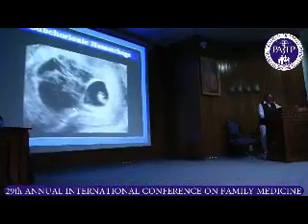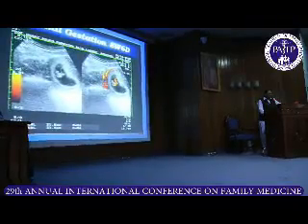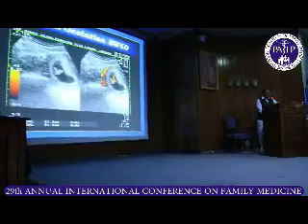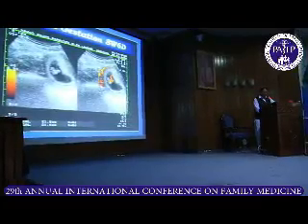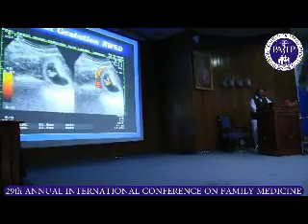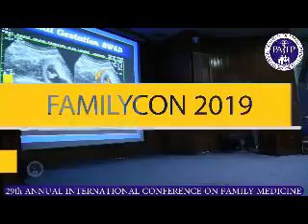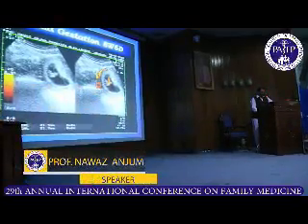And here you can see subchorionic hemorrhage. And here you can see an 8 weeks fetus with embryo, and you can see a small umbilical cord developing, and this is a flow in the subplacental area.